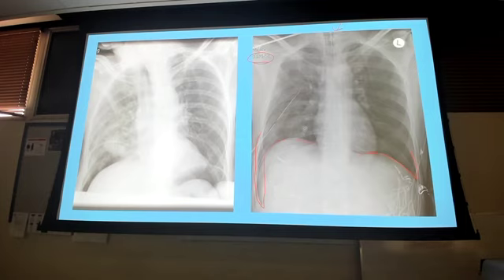Now my question becomes, can I distinguish on this x-ray, right, I know I'm playing guess what I'm thinking, can I distinguish from this chest tube and this picture whether they put this chest tube in due to a pneumothorax or due to a hemo or hydrothorax? Yes or no? What is it about the costophrenic angles that gives me a really good, confident answer? I could have drained all the fluid. The chest tube could have taken all the fluid out.